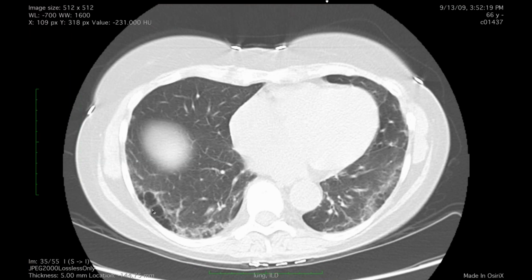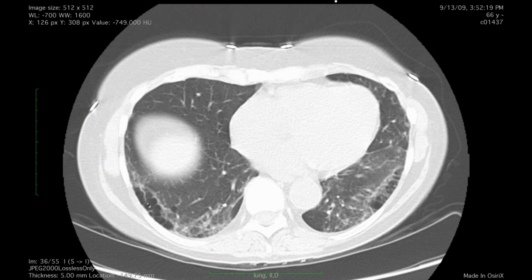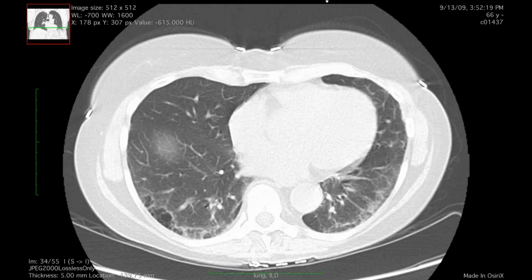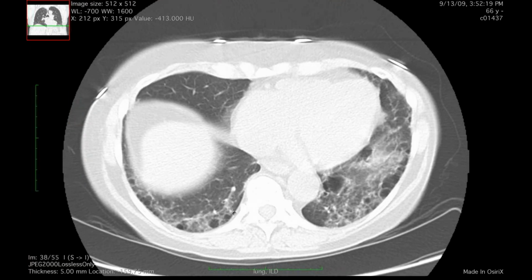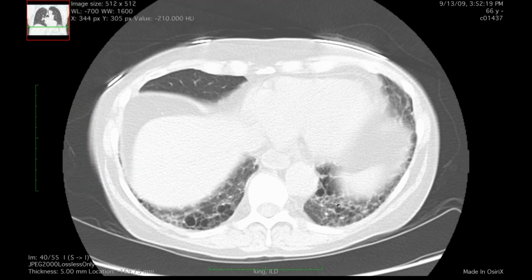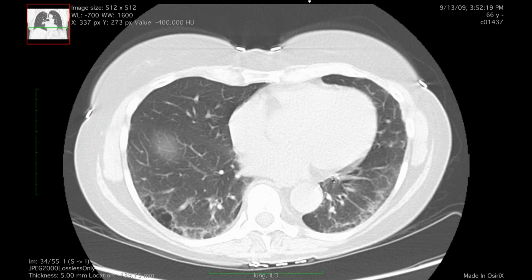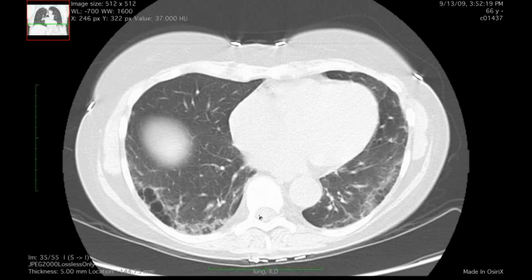And again, when we see these bigger air spaces, we start thinking more about smoking-related fibrosis and airspace enlargement with fibrosis rather than just discrete honeycombing. And moreover, she doesn't really have a lot of traction or reticulation. Unfortunately, this is the only CT I have. It's from an outside hospital, so it's thicker slices. But what's interesting, she had a significant secondhand smoking exposure. She wasn't a smoker herself, and she didn't have a connective tissue disease.